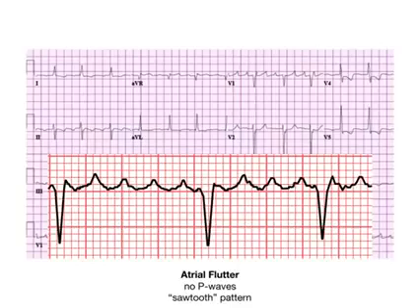So look for P waves, and after that, just look at the ECG and get the pathologic finding because it's going to be obvious. So we've done AFib, we've done A flutter, we've done STEMIs, and we've done Wolff-Parkinson-White syndrome with the upslanting delta wave.